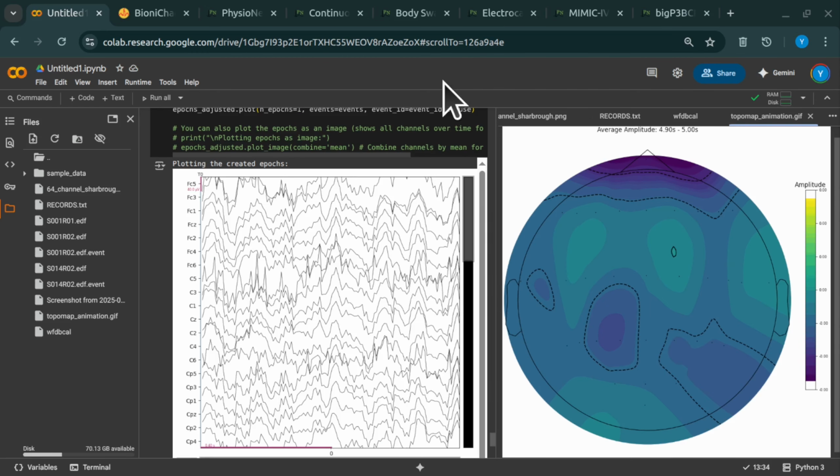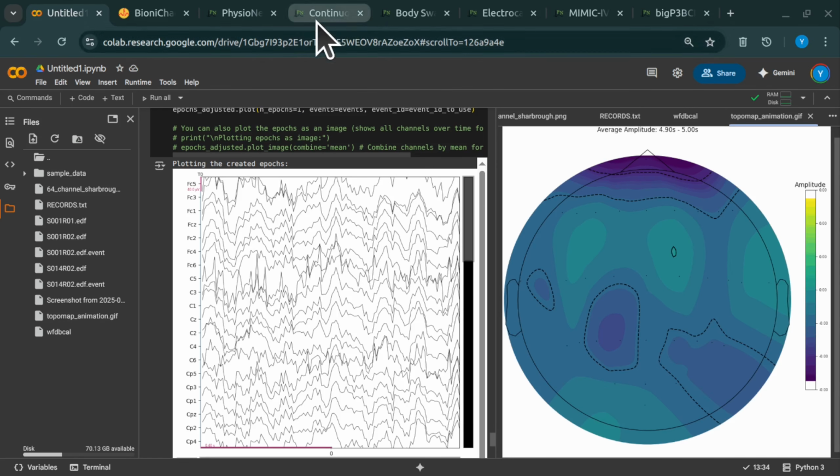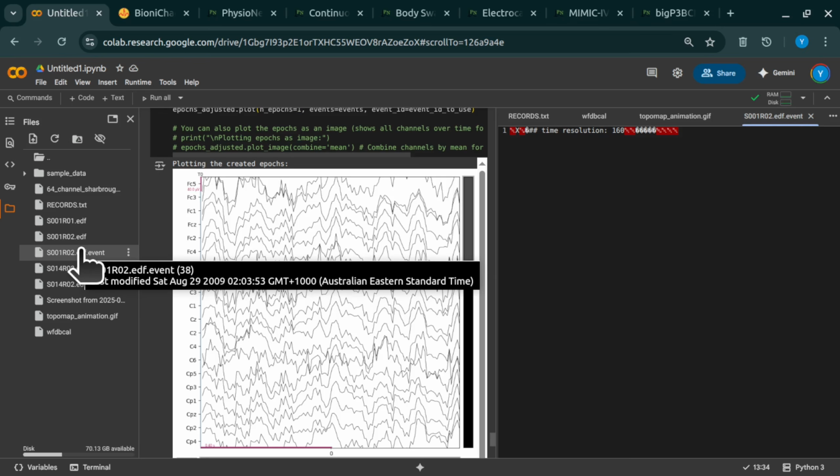And there is a human in the loop as well. And yes, this dataset, we didn't have much luck with it. Well, because we couldn't actually decode the event files. And I have this time a weird time resolution. Maybe we can try it one last time.